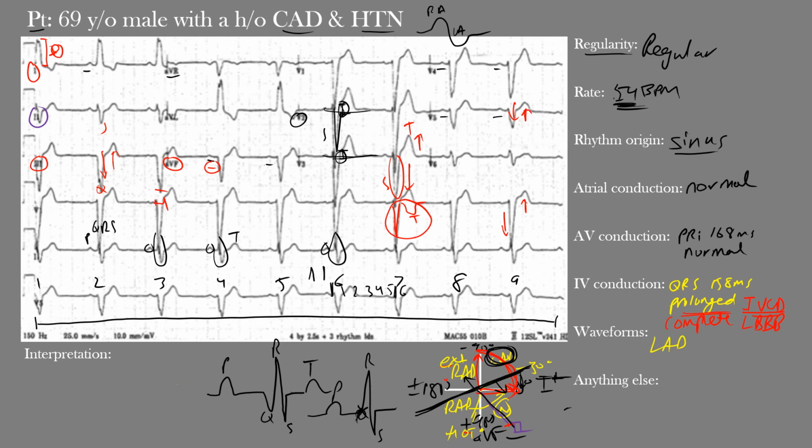So let's take a look at lead 2. Lead 2 is here, and we see that it's mostly negative, below, meaning that it's on this side, which means that it sits in this region here, okay? We said this region here is beyond that negative 30. The actual axis here was negative 40 degrees. So again, beyond that normal range of the leftward axis. So we call that left axis deviation, okay? And it's more of that abnormal form.